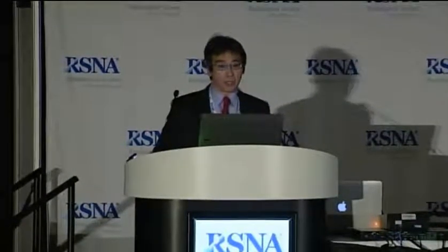Okay, this morning I'm going to talk to you about quantification of coronary stenosis by coronary CTA: accuracy, difficulties, and functional significance. First, I'm going to talk about detection of coronary stenosis, and then about quantification of coronary stenosis and how you do this, and why it's not the same as detection. And then in the final half of the talk, I'm going to talk about the functional significance of coronary stenosis when you see it on your coronary CTA.